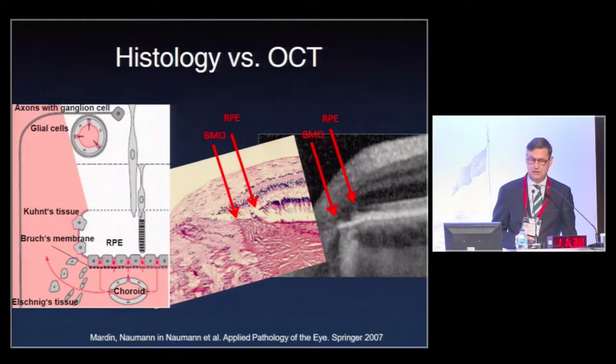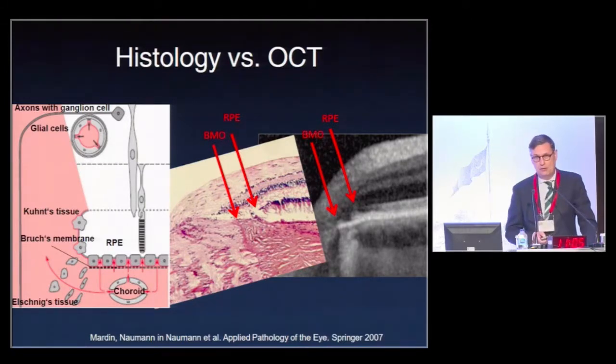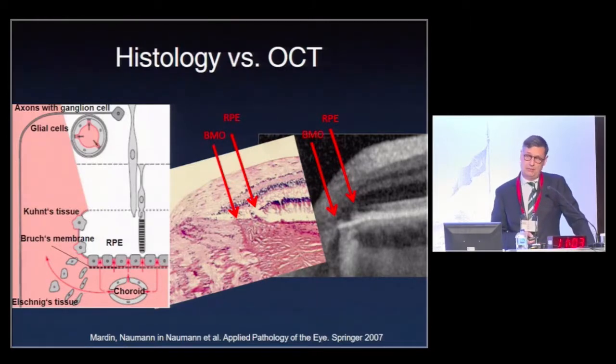imaging. In the middle, you see a histology slide of a patient where we had to remove the eye, and on the right-hand side, the OCT directly belonging to this patient before removal of the eye due to a melanoma. And you see the fine match of the OCT image with the histology image. So OCT gives us the ability to see all the structures we are interested in glaucoma, and we try to use them to diagnose glaucoma if we are unsure about the early diagnosis, and of course, more helpful, we use it for following up our patients.